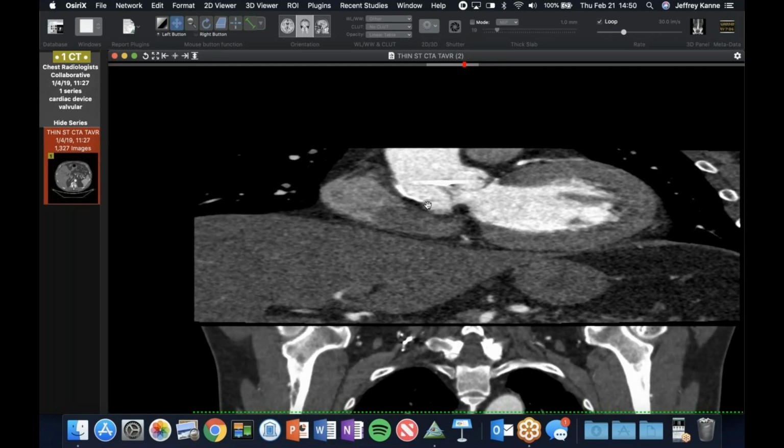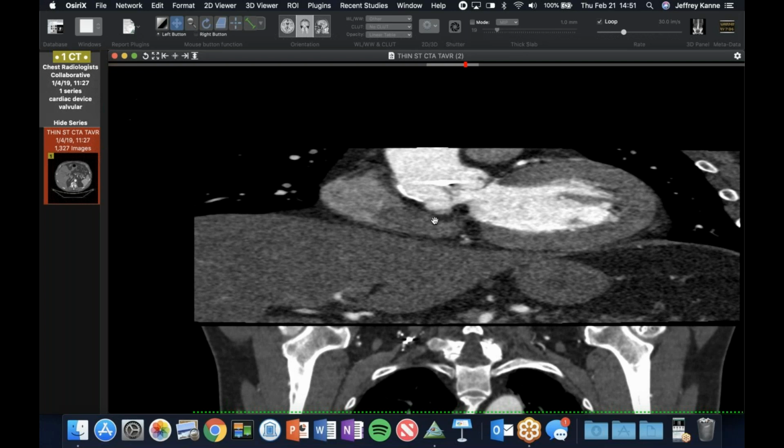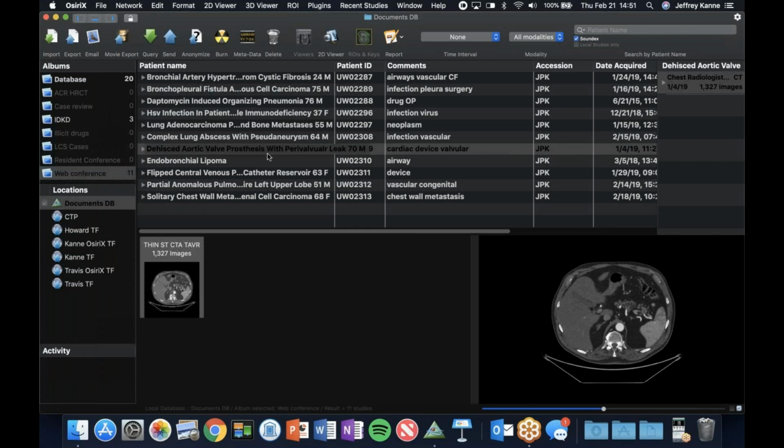It's easy to miss stuff on tops and bottoms and axial planes, and always important to use multi-planes to look at this stuff. But a nice complication of that.